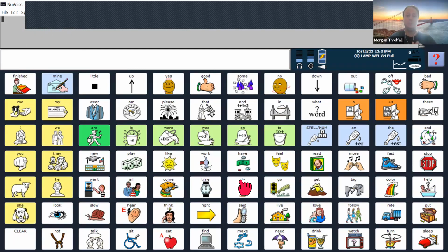That's a really great feature for the classroom where students are learning literacy or need to produce some written work, and that can help them to achieve that from their Accent device.